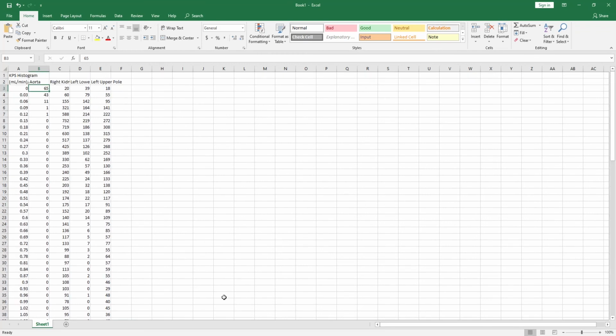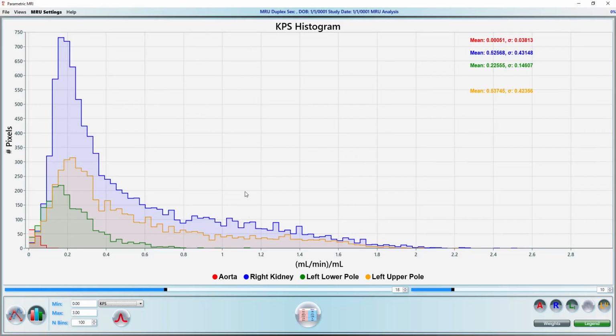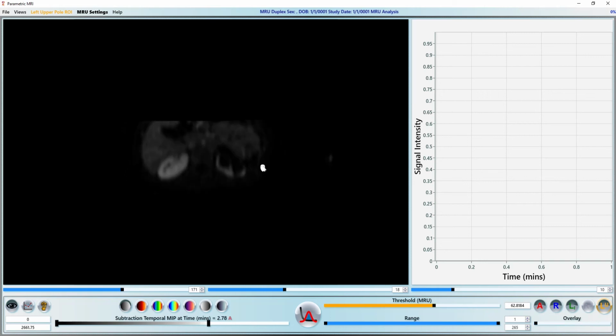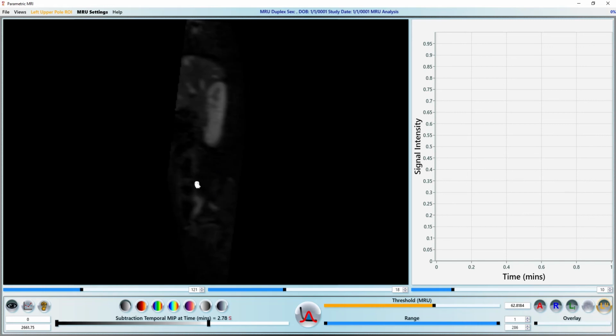Let's look at some 3D volume projections. Let's go back to the analysis page. To make a volume projection, we first need to change the image orientation to freely rotating. Press space to switch between axial, coronal, and sagittal planes until you get to the rotating plane, denoted by the letter R next to the map type. Press M to make a MIP.